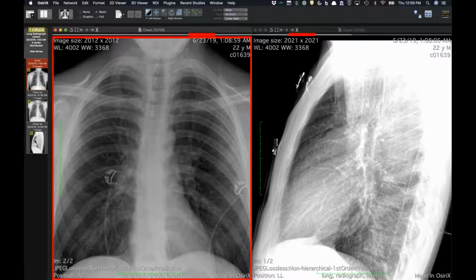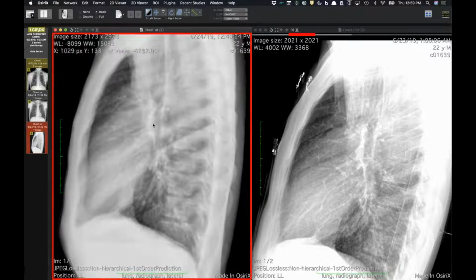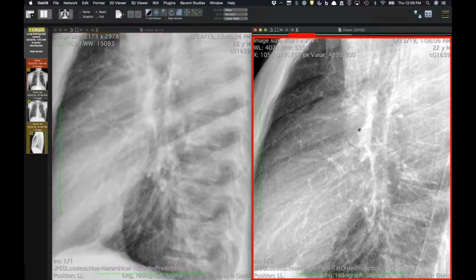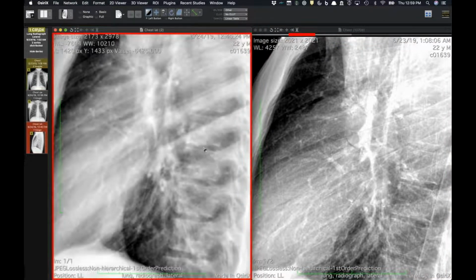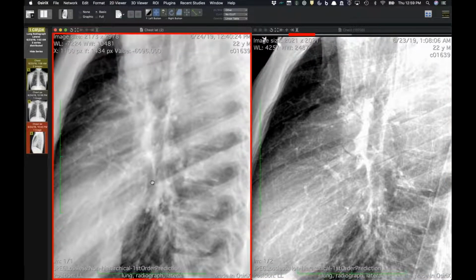And then the next day they repeated, and I'll show you the follow-up lateral, and the findings are gone, or maybe there's still minimal here along the aorta. But I think it's one of the better examples of the ring around the artery sign from the right pulmonary artery that I've ever seen. So subtle finding, and the clinical team totally agreed with that. And so probably had alveolar rupture on the right, and it just tracked back into the right hilum.